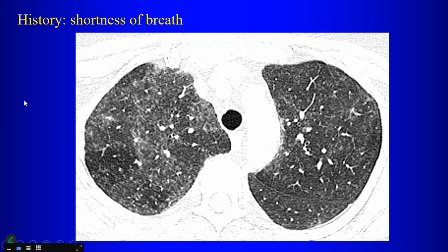Okay. Patient is short of breath. The finding on the CT is what? Is that miliary? Tree and bud? You see tree and bud? Centrilobular what? Ground glass. Yeah, this is ground glass attenuation, right? We don't really see well-defined nodules here. We see ground glass opacities. Of course, that's going to have a centrilobular distribution. So also maybe a little mosaic attenuation from air trapping. So that combination then of centrilobular ground glass opacities and some air trapping, what disease is that going to suggest?